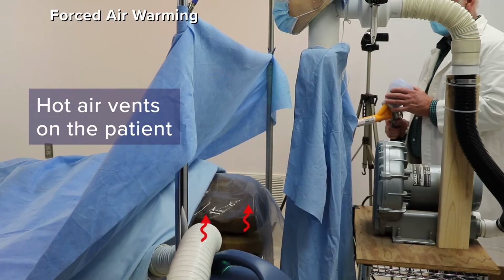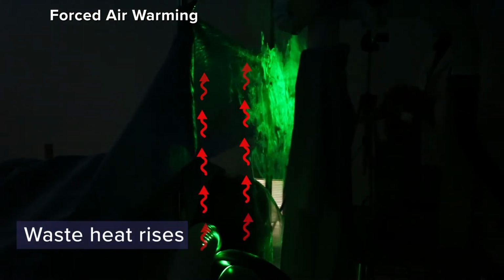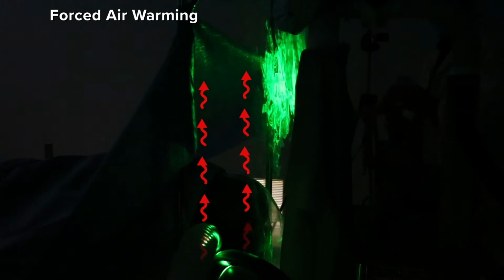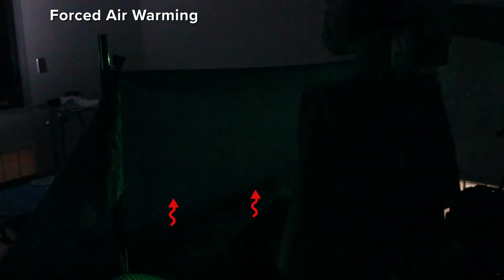Forced air warming systems blow hot air to warm the patient. The hot air is vented under the blanket, escapes, and rises along the anesthesia drape. The rising waste heat transports airborne contaminants, including bacteria and viruses from contaminated areas.